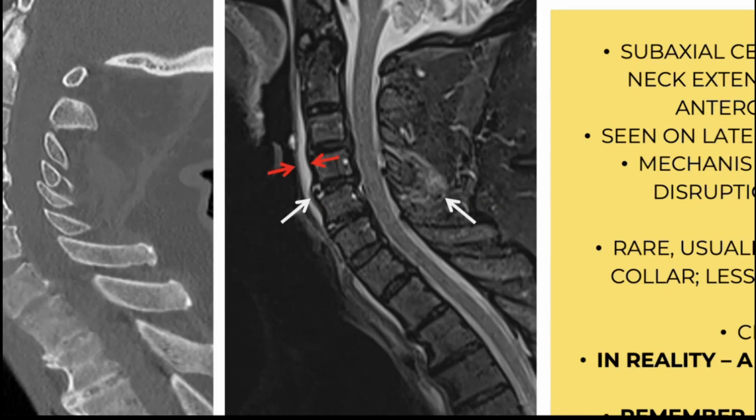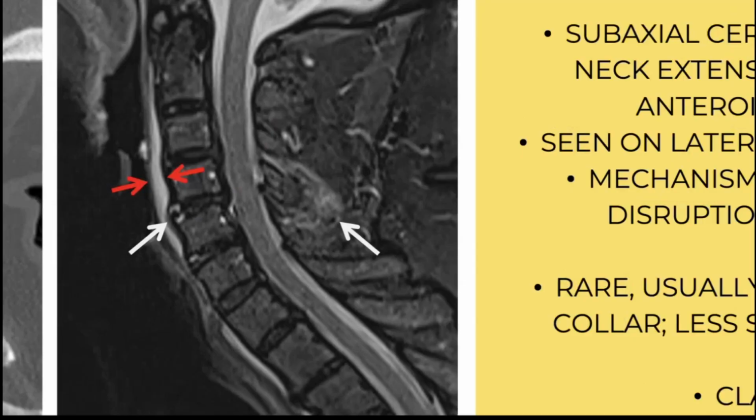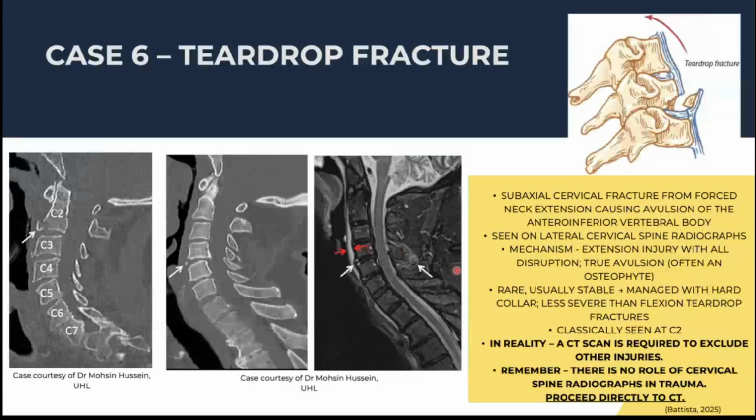And if you look at the white arrow posteriorly, so if you just point to the spinous processes there, if you could, with your cursor, Abigail, just at the back. Yeah, when I go to the cursor, it hides but here. Just yeah.